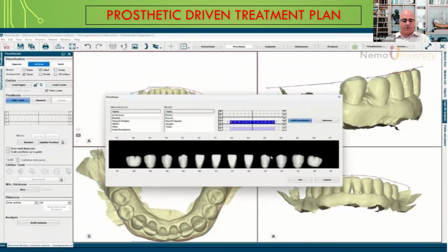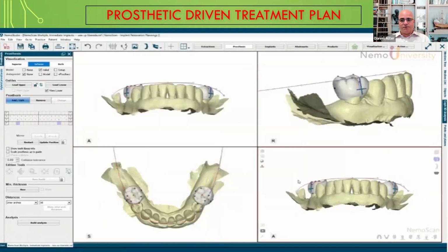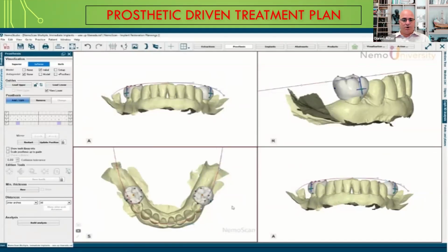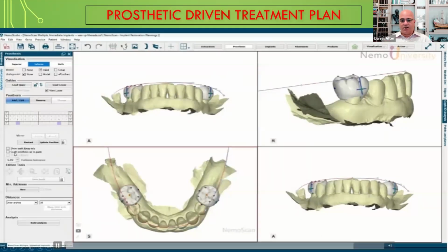which we have in the software, the ability of actually extracting teeth while replacing teeth. So that's a perfect example for the stackable, where we can actually eliminate or extract teeth virtually, in order to then come back and create a bone guide, as well as a surgical guide, all the way to a prosthetic, all encompassed within one single software, as you see here. So now that we've selected the two molars, it's going to populate it for us, or aggregate it for us. We're then going to utilize typical CAD/CAM principles to place it in the right location of where I need it.